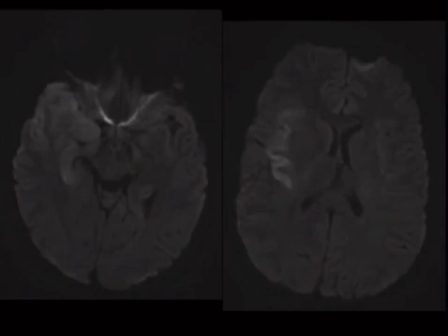I'm going to show you diffusion. I'm showing you two slices, and I'm showing you these slices for a reason. One, I'm showing you that it does restrict diffusion, which should not throw you because herpes encephalitis, which you probably know is the answer to this case, classically restricts diffusion. In fact, that's the most sensitive sign. It's supposed to be the first thing that happens. But when we go up here, it's sparing the basal ganglia, because remember, we have a list in our mind of the things that restrict and don't restrict diffusion.